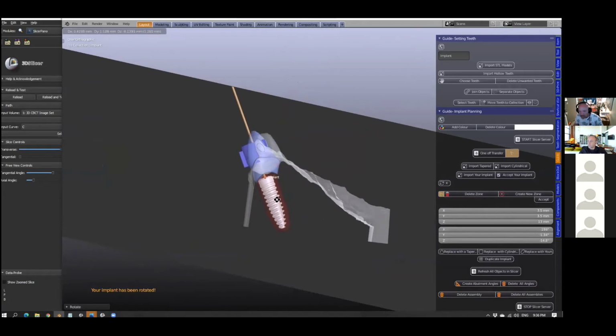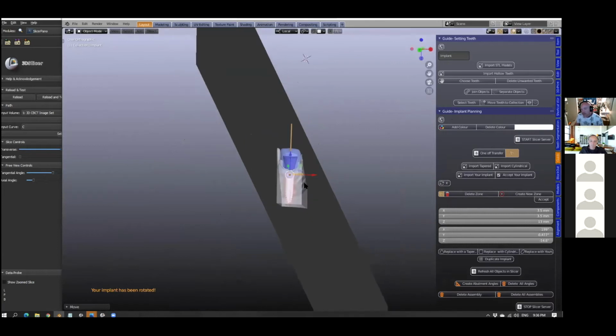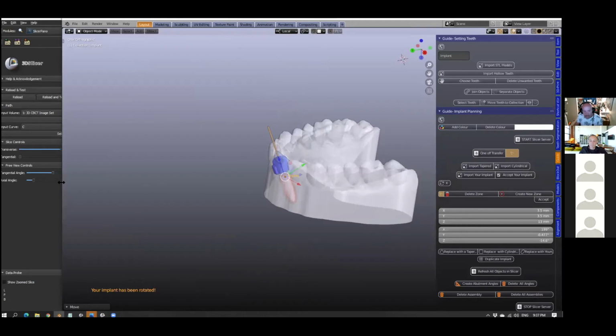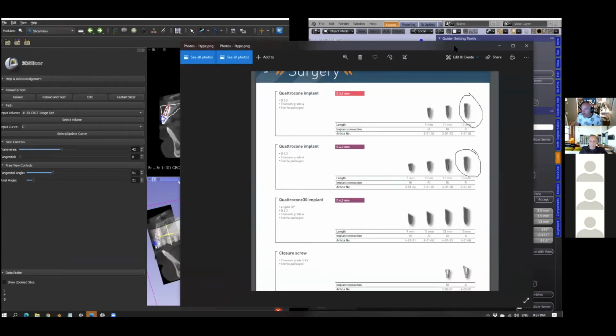Okay, so I've done this a few times, and I know this is going to come out of the incisal surface. So it's probably something like this, but we can now check it. So let's check and see where this implant in 3D Slicer is. So it is ported across. This one we don't need anymore.